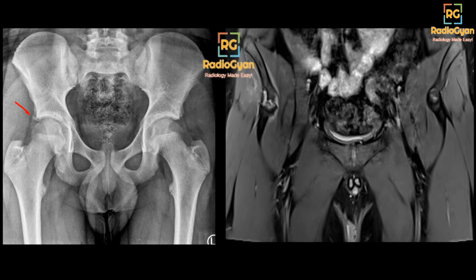If you compare this versus this, you see this tiny bone fragment here. The same thing is seen here. We don't see the fragment really well here, but there is this fluid separating the anterior inferior iliac spine and this tendon. Here it's normal. This is the normal attachment to the anterior inferior iliac spine. So let's see if somebody is saying Perthes. The femoral head looks okay to me. I would not suspect a Perthes here.